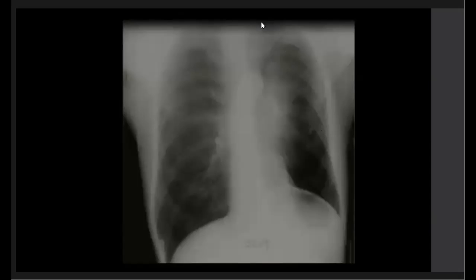Here, a patient with opacity with no air bronchogram in the upper mid zone associated with hilar enlargement, and it is due to bronchial carcinoma of the left bronchus causing left upper lobe collapse, and this is obstructive atelectasis.